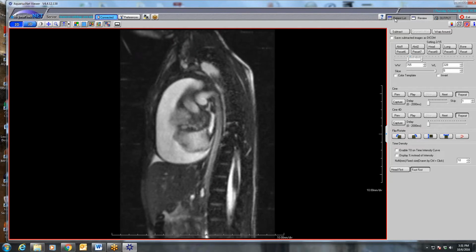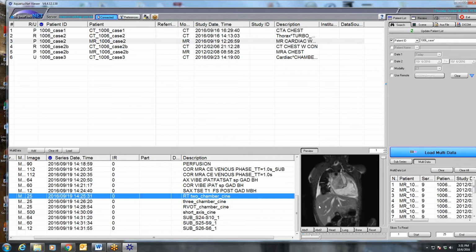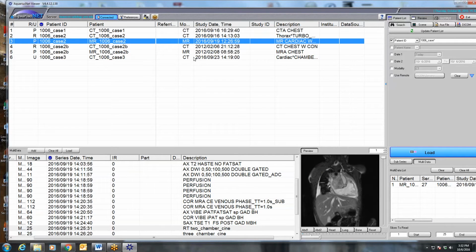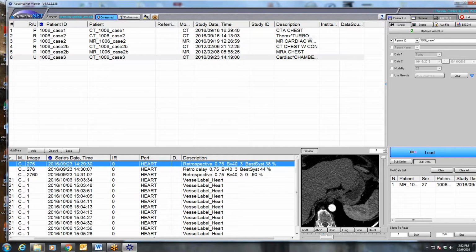And on the MRI that we did on this patient, which has so many sequences to pull up, it's basically almost identical. You can see here, it's within the pericardium, surrounded by pericardial fluid. It's not mediastinal. But we spent time trying to determine that one way or the other.